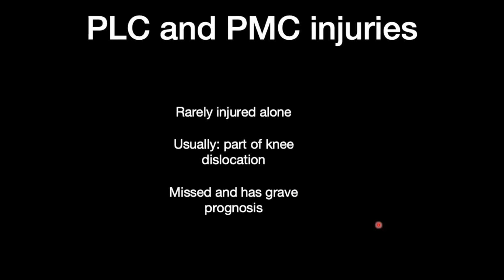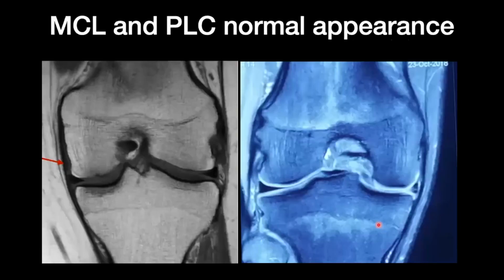So PLC and PMC injuries rarely occur alone. They are usually part of knee dislocation. Usually they are missed, and if missed, they have grave consequences.